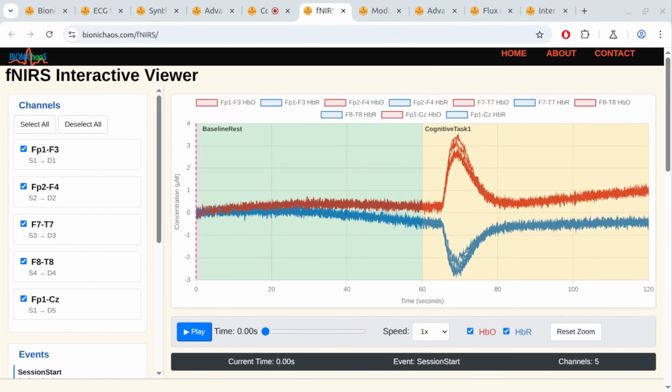Okay, I think the settings for the browser volume was just too loud or something, so it was saturating or something. Can you explain what might be happening?